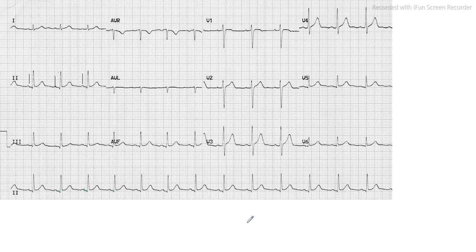Now another thing to look at is lead 2. You see here lead 2. In lead 2 the P wave must always be positive. So this is also another criterion. In lead 2 the P wave must always be positive.